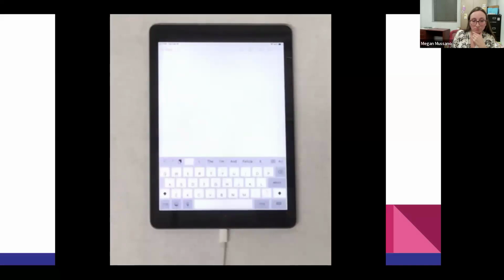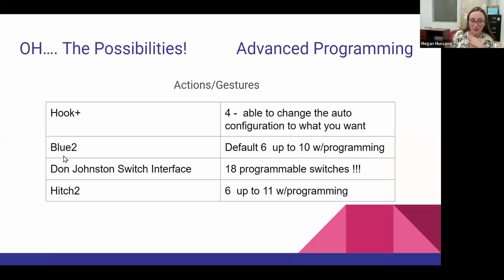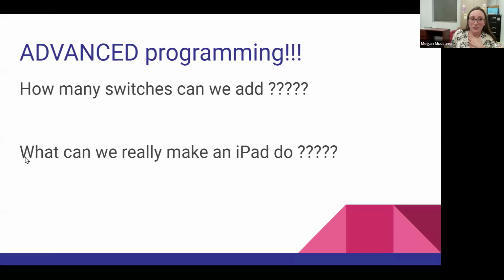That way, when you go into any app, you will see that when you do the arrow up, you'll see a tap middle of the screen. When you do the arrow to the left, you'll see a swipe, and arrow to the right, you'll also see a swipe. So those are the finger movements that these 3 switches are now programmed for. Those could be used in a variety of apps depending on what your need is for that given app.